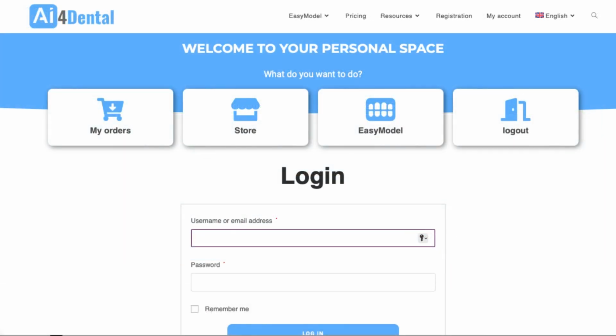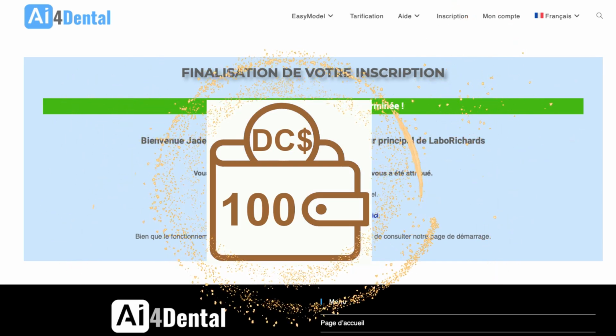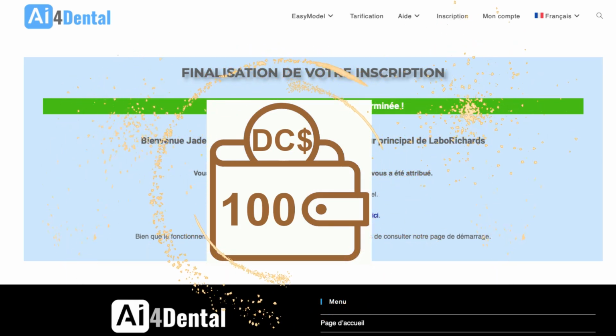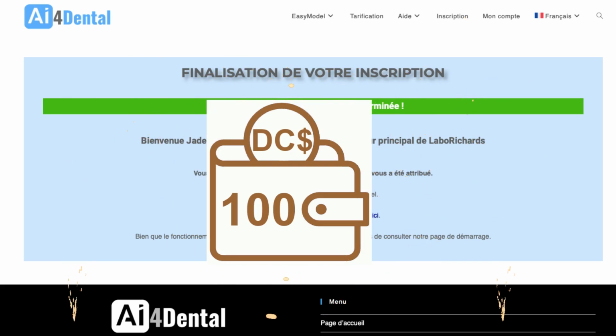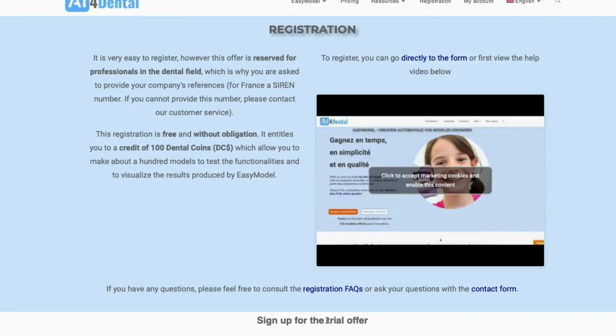With your registration, you have been credited with 100 dental coins that will allow you to test the application, which should be more than enough to familiarize yourself with EasyModel, knowing that 1 dental coin corresponds to the creation of a standard model. Moreover, you now have access to the user documentation and in particular to the tutorial which will guide you in your first steps.